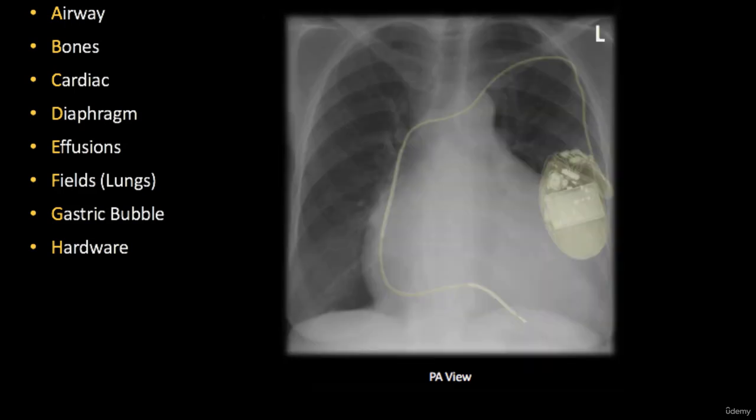If patients have any devices in their bodies, such as nasogastric tubes or electrostimulators or EKG electrodes attached to the skin, of course, all these devices will appear on the X-ray too, and it will allow us to check whether they are installed correctly, whether they are in the right place or not. So this is one more point to focus our attention.